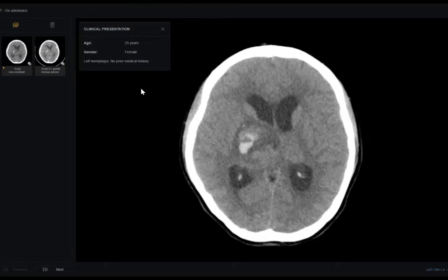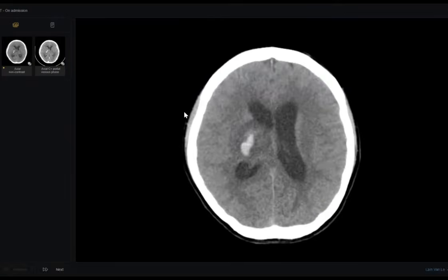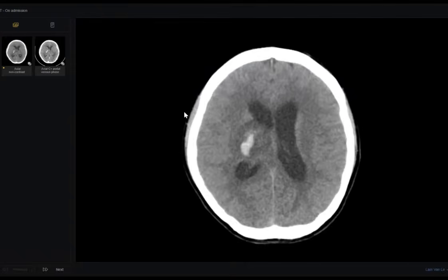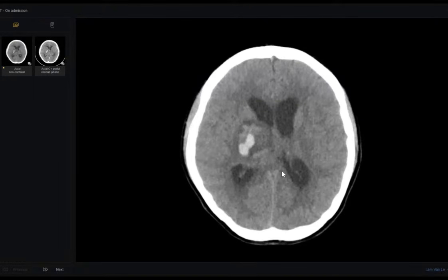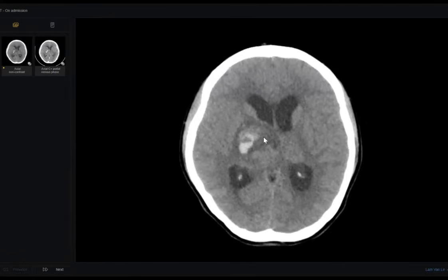The patient has a sudden left-sided hemiplegia, and this is very common, by the way. And the patient is so young. What happened? There is a very clear hemorrhage in the basal ganglia. What comes to mind? A hypertensive hemorrhage. Very clear, no doubt. Why? Because intracranial hemorrhage due to hypertension is commonly seen in the basal ganglia due to end arteries.